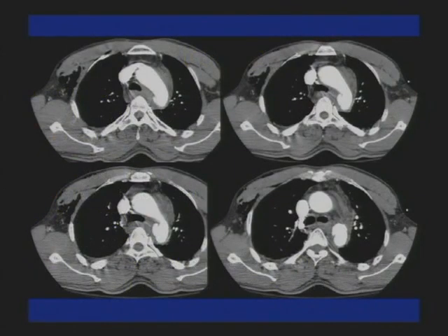Okay, here's the CT scan on the patient I showed you with the wide mediastinum on chest x-ray. We see a few findings. We see a lot of blood in the mediastinum. That mediastinal fat has now been replaced by all this amorphous high-density material. And not only that, we see a little focal saccular outpouching right in the region of the ductus or the ligamentum. And that's a great site for traumatic aortic injury. Looks like a pseudoaneurysm, focal saccular outpouching with a narrow neck.